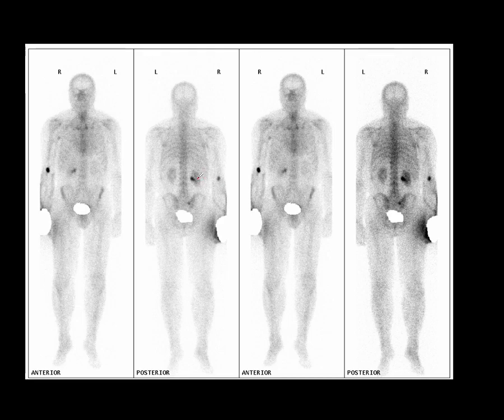Here's one that's quite interesting and important. We've got an area of increased activity. Well, we don't know what it is, but for some reason our technologist has placed a region of interest over the hand, just like the region of interest they usually place over the bladder. So why is that?